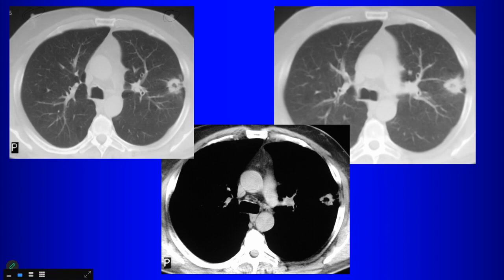So for this, given the topic of the lecture, what are reasons why you would favor cancer in this case as opposed to infection? The thickness of the wall, when it's greater than 15 millimeters, it's typically more concerning. So the thicker the wall, the more concerned you are going to be about malignancy. What about the edges of this thing? They're spiculated. Yeah, so you have these spiculated borders around it. So that's another reason why you should be concerned about this, right?